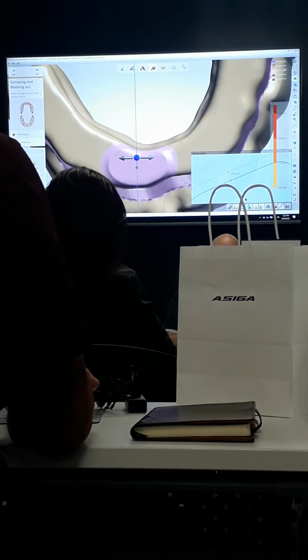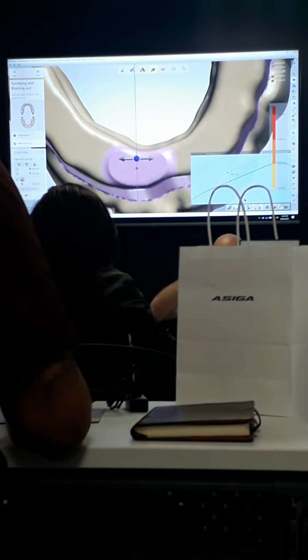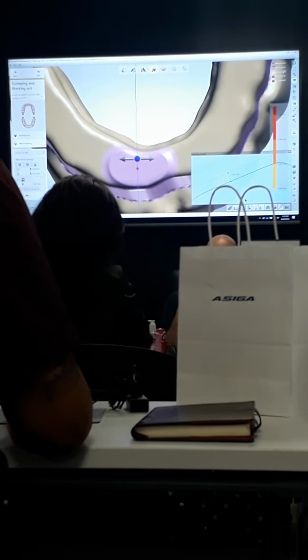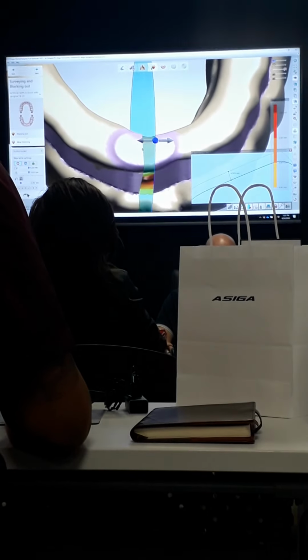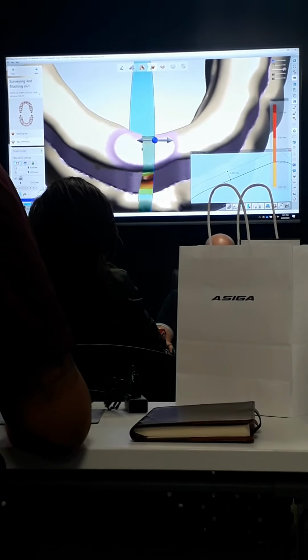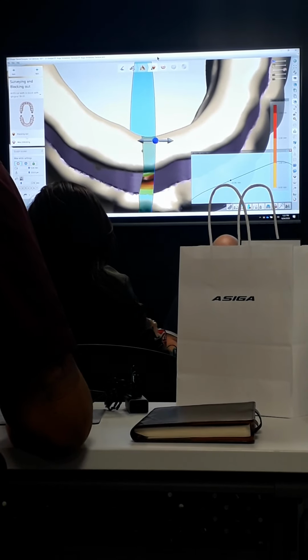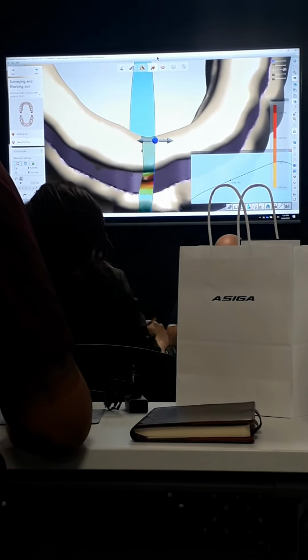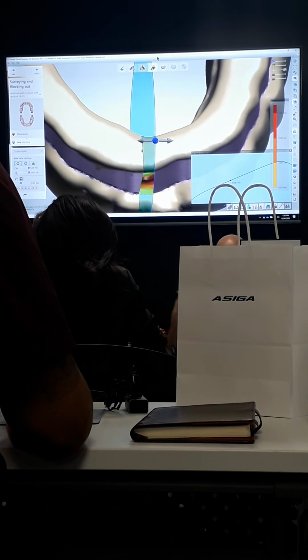So I could just add all the way around my scan, my arch, and then I would get a perfect 0.5 millimeter space everywhere. So I could do a wash impression in the entire denture, if you wanted to do that. That's obviously not something that you have to do. It's just, if maybe the initial impression was really bad, you could design a try-in denture, put a wash impression spacer in it automatically with this, and then when the doctor gets it, he knows to take a wash impression in it right away.